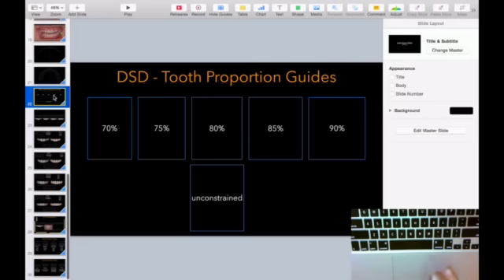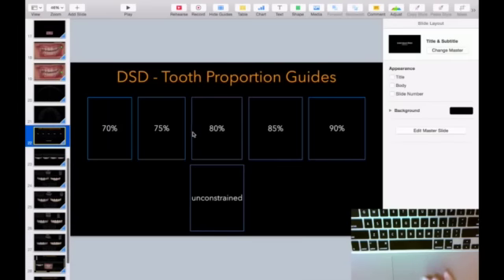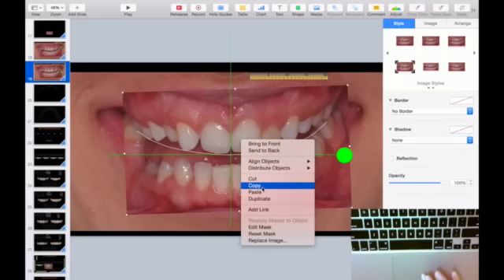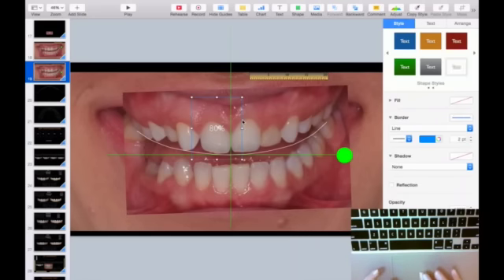And then I go to the first one here of the templates, and I'm going to get a proportion for the centrals. And these are the most used. If you stay in between the 80%, it's most likely to look good to the eyes. So let's try to see how this one looks first. And we know also that I can go up a bit on the gum, that it's going to look good if I go a little up.